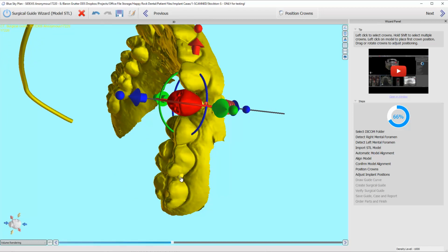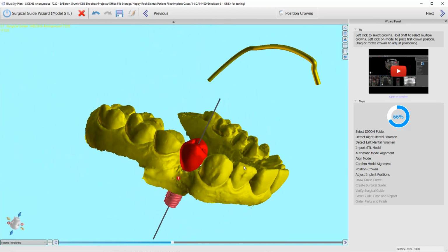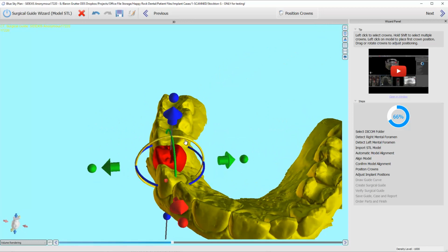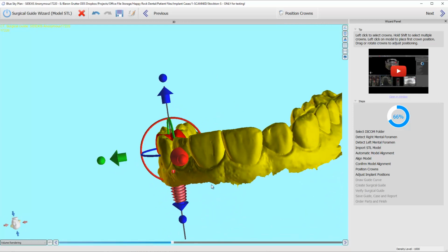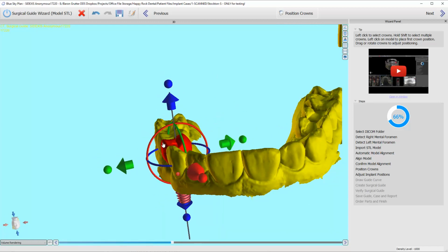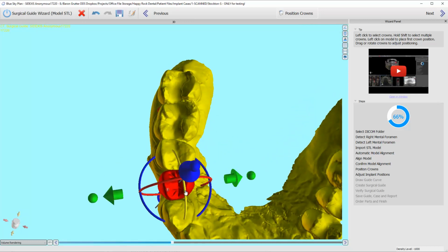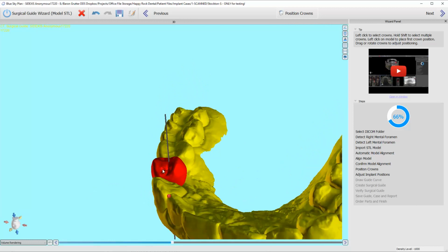And this doesn't have to be perfect by any stretch, okay? This is not going to be a permanent crown. This is just going to give us some information of, okay, this is where I think I want the final crown to be, so let's plan the position of our implant accordingly. I can tell you from reviewing her CT scan chair side that I'm going to have this implant pretty angled, okay? The hole is probably going to come to the buccal cusp in that area, just because that's where the bone she has available, and grafting, though possible, seems awfully unnecessary in this situation.